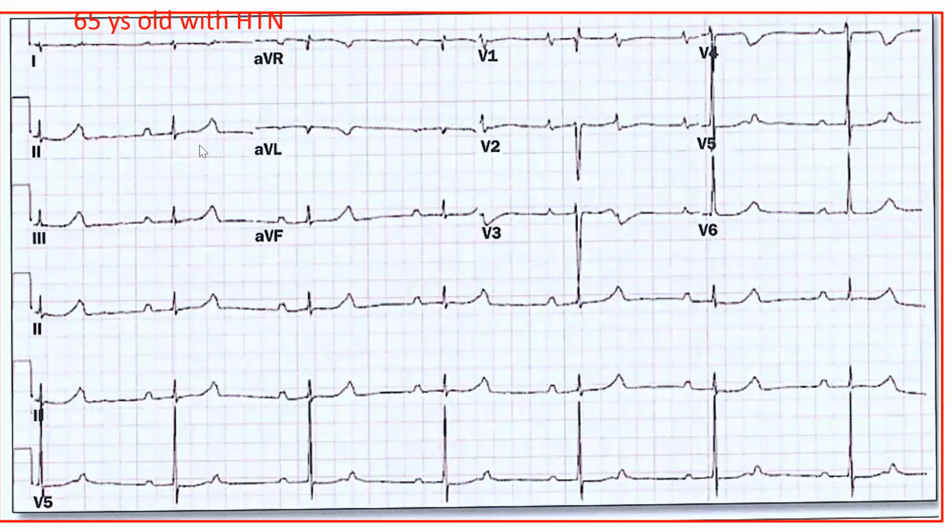Next, for this patient, we have this ECG. We have a P wave, then a QRS complex, then another P wave without a QRS complex. To identify the second P wave clearly: is this P wave coming on top of the T wave? We can identify it clearly in lead 1 and also in lead 3. We have seen the P and the T wave, and the P wave, especially in lead 1, has similar morphology. So you have 2 to 1.